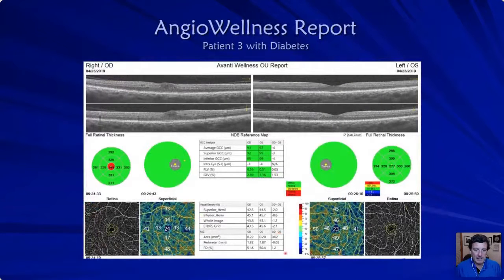Now, we can't really rely on everything that I told you, and that's why I said it complements each other. Look at this. Oh, look, 0.22, 0.20. Oh, well within that range that Caldwell talks about. But when you look here, I don't like this area. It looks like there's some capillary changes over here. You come over here, it's a little distorted, but it passes the test. But when you come up here, look what you see. In the B scan, now you're starting to see some leakage.